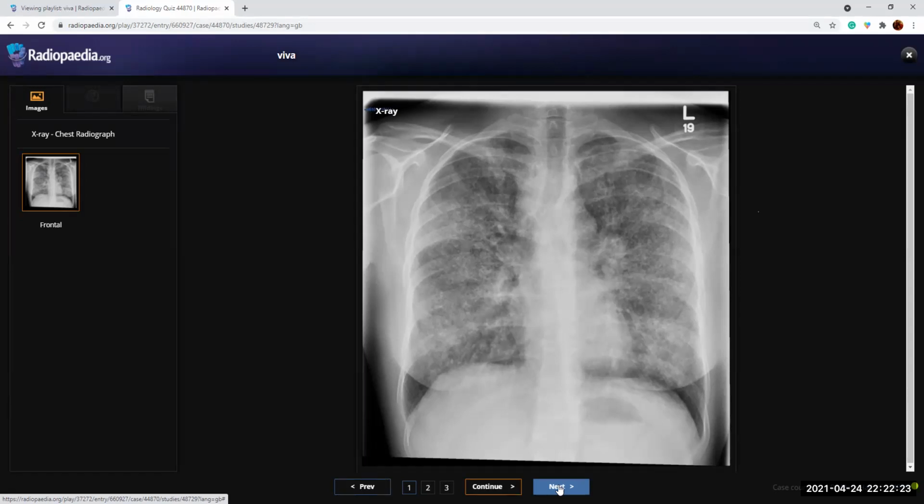So in summary, given that this patient is a smoker, the possibilities for multiple nodular and interstitial shadows would include a respiratory bronchiolitis ILD. Langerhans histiocytosis is also another possibility. Any other differentials? You mentioned some other findings also. Yes, for the lymph nodes as well, I would also be doubtful that this could be related to sarcoidosis maybe. So how are you going to know what is what? In that case, first I will check any previous X-rays for previous findings and interval changes. Okay, in that case, I will refer the patient to the chest physician and request a CT scan of the chest for better assessment.